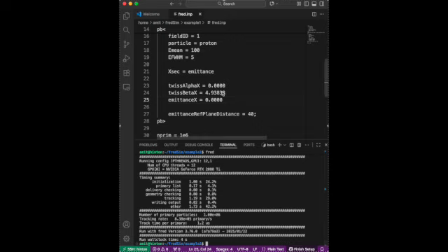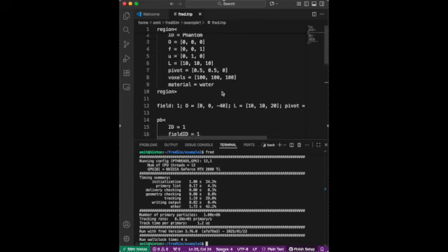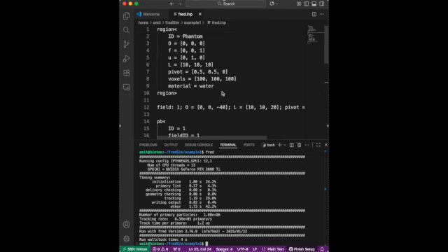This time the simulation we did was with 100 MeV protons. We have 1 million protons, and it does not have any beam spot. It's a pencil beam. And now I want to see the result, of course.